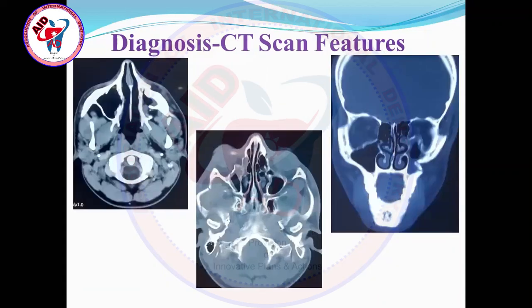Okay, then in this picture, the axial views as well as the coronal view are on the same slide, so that you can have a better idea of this. Look here on this axial view, this is on the soft tissue window, because the whole bone is radiopaque. Look here, this is the lateral pterygoid muscle going from the condyle towards the pterygoid plates, and this is the coronoid, this is the condyle, and near the coronoid there is the masseter as well as the temporalis muscle.